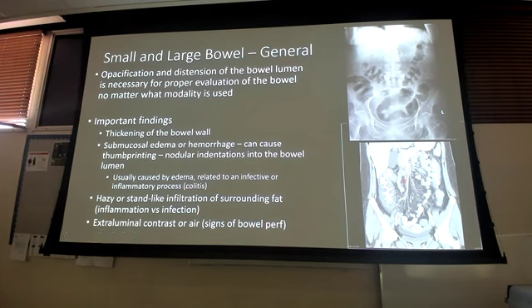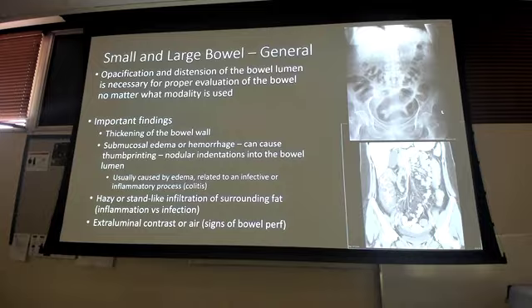You can see it here. See this stranding there on the descending colon area. Let me erase it and draw it again. Kind of in this area here, a little bit up here. You see what's called fat stranding, that hazy linear appearance, typically surrounded by more radiolucent, darker gray appearance, right? Because that's going to be your fat, your visceral abdominal fat area, okay? And you're going to have those little stranding areas because of the inflammation.